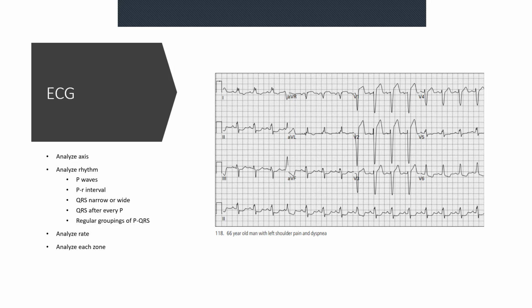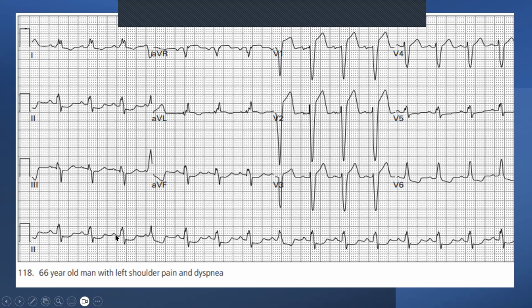And I've noticed a lot of the requests I get for consults on ECGs actually come from left bundle branch blocks. And a lot of the misdiagnoses that I see also come from left bundle branch blocks. So we're going to analyze this and see. A left bundle branch block can also be a hemi block. If you'd like to learn more about hemi blocks, we have an older lecture that deals with it, so you can go back and have a look at that. But here we're going to talk specifically about this patient.